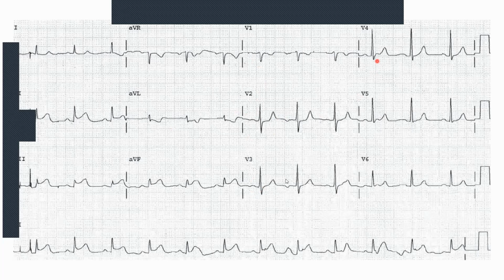We come to V3 and V4, and in V3, we can see what looks like an ST depression, even though it's mild. And then we come to V4, and it looks almost like an ST elevation. On V5, we don't see much. And then on V6, we see what seems to be also a bit of an ST elevation. And then on leads 1 and AVL, well, on lead 1, there's not much. And on lead AVL, we've got an ST depression over there.